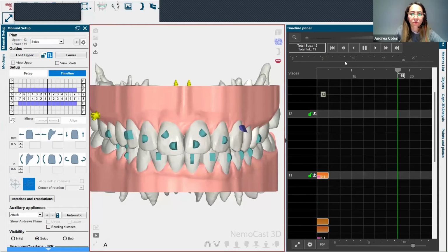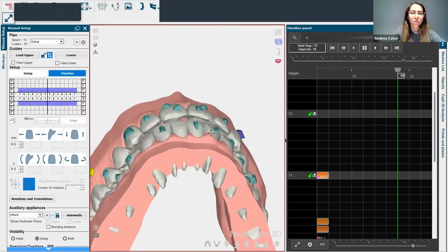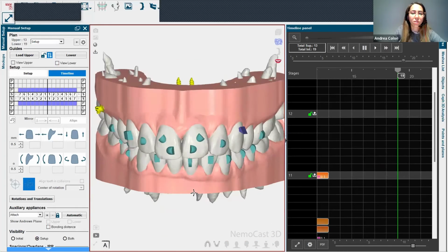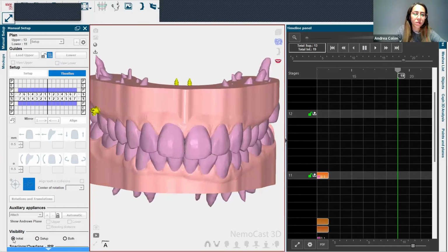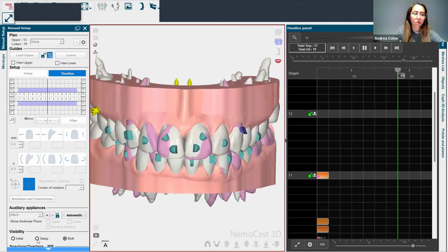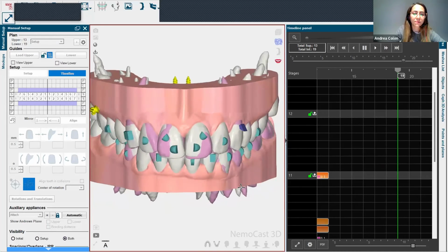All of that is reflected in this powerful visualization and video to share. You can also see the initial stage in a different color, and then watch both to see the discrepancies.